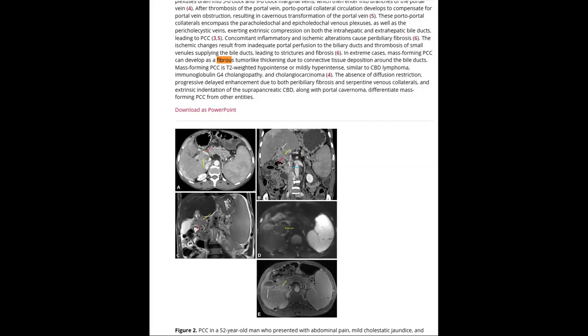If I saw this, you would still biopsy this though, right? Would you feel confident that this wouldn't warrant it? I know the diffusion is not suspicious, but it still looks pretty concerning. I think biopsy would still be warranted. We can't be sure. It's an interesting diagnosis academically, but in clinical practice I would want to biopsy. Agreed. What's interesting is this one is not a post-liver transplant patient. So I was bringing up PTLD for the other one, but here we wouldn't bring up PTLD, we'd probably just bring up lymphoma. Yeah, but I agree, probably need to biopsy.